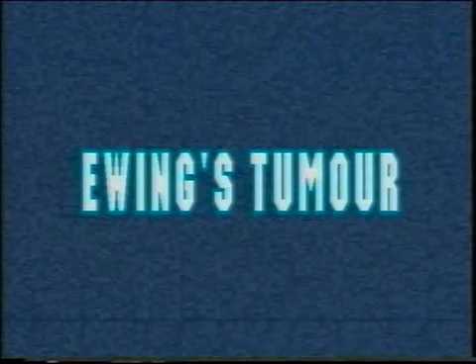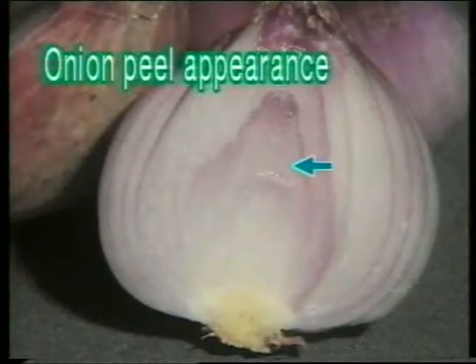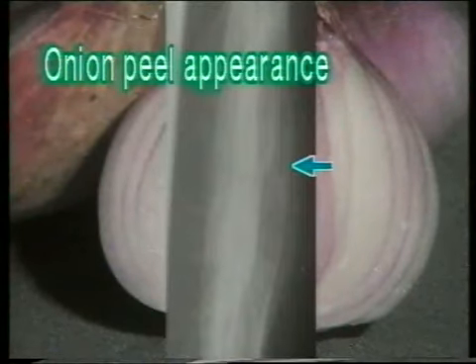Ewing's tumor. In this X-ray, we see a tumor in the shaft of the fibula, that is, in the diaphysis. On close observation, we can see that the bone shows areas of osteolysis, while the periosteal bone deposition has occurred in layers, giving a typical onion peel appearance. Note the cut surface of an onion and note the similarity with the layered bone formation. This is an Ewing's sarcoma with onion peel appearance.